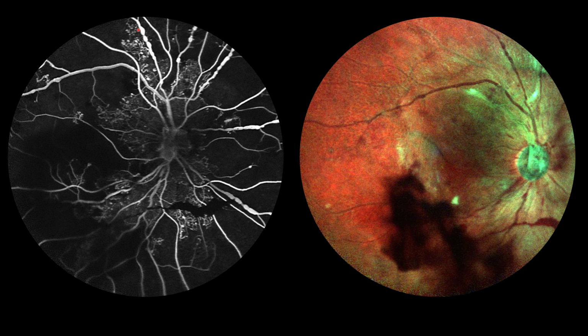Also, if you look at this blood vessel, it is looking like what we call a sausage pattern. So this is venous beading, and this is also not normal. We don't normally see blood vessels getting dilated, and these beading patterns are not normal. These are also signs of severe ischemia. So just by looking at the angiography, we can make out how much of the retina is perfused. For example, in this area you can see the blood is flowing freely up to this point, but beyond that the capillaries are blocked. But look out for the blocked fluorescence, separate that from the vascular occlusions.